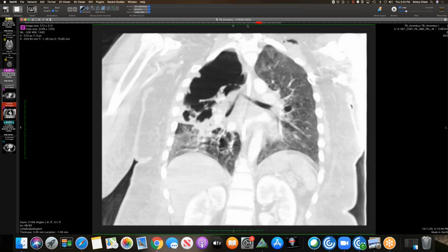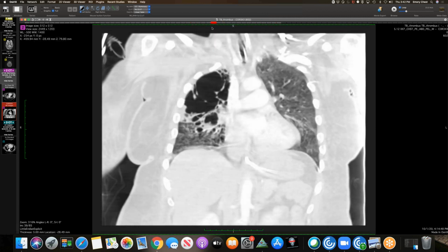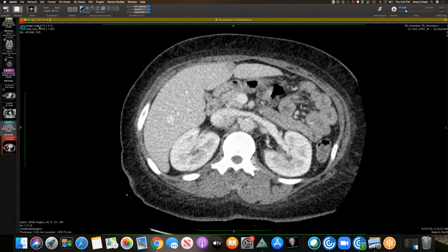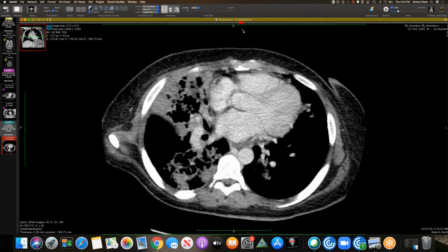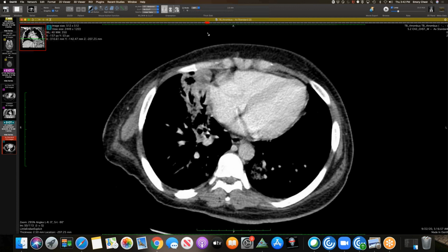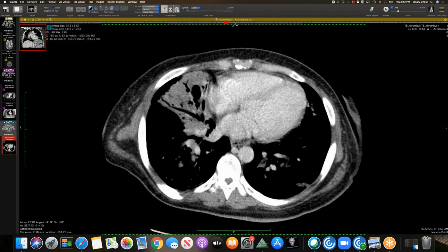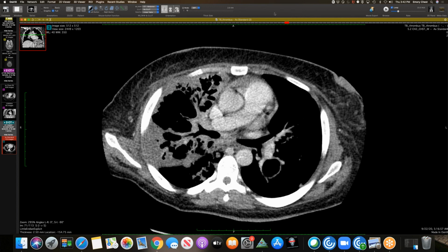Yeah. But yours are neat. They're kind of like little Cheerios. Yeah, so what I've read about it is there's two appearances. The more common one is the TB appearance with the fibrocavitary lesions, and then the less common one is more circumscribed nodules with cavitations. It didn't say which one is which population, but this guy was an HIV patient.